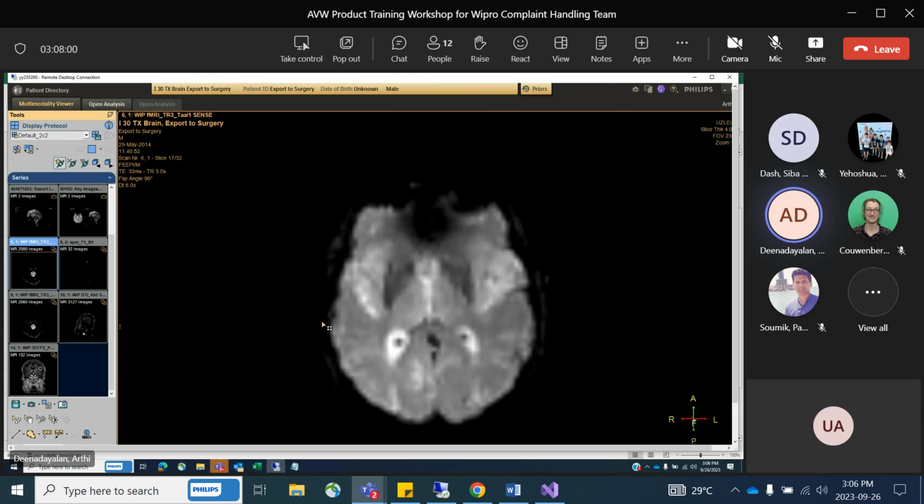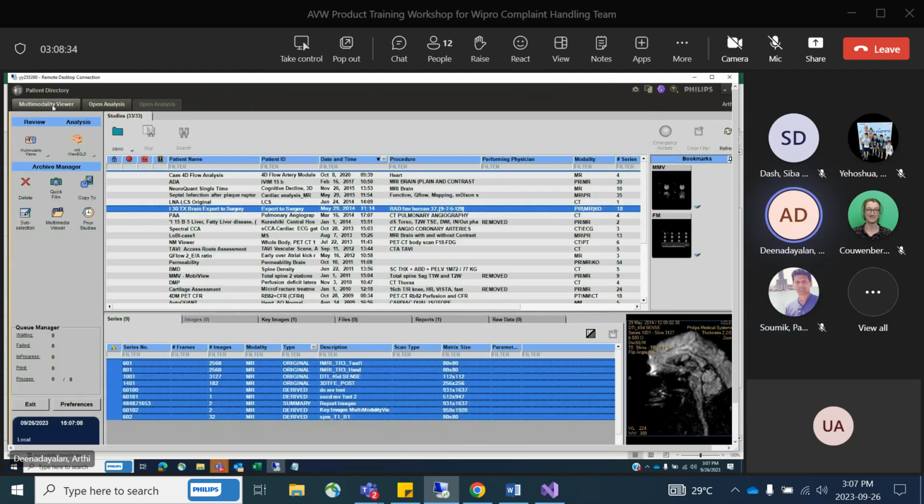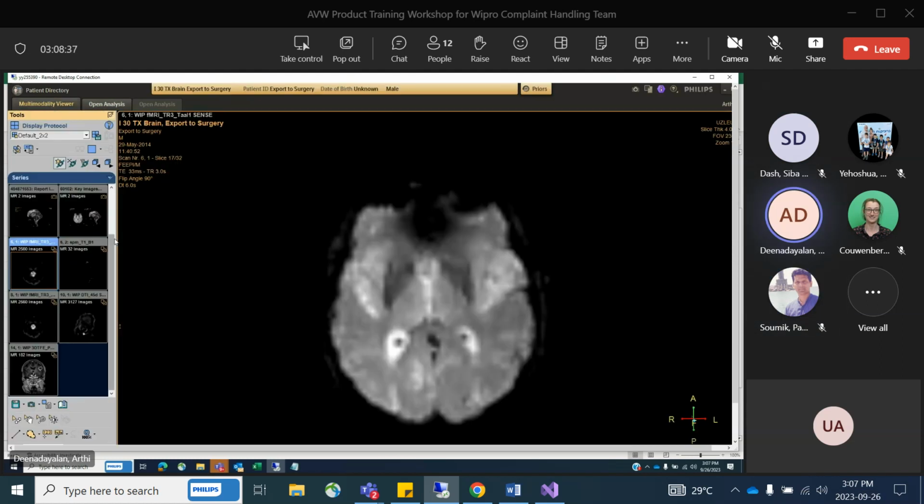So far, any doubts? How to check the dynamics, how to load the data to fMRI. The basic functionality on fMRI is only that. There are many other things, but I don't think you have to know all those things; these are the basic things. Can I go ahead with the next application? Yes. Okay, so I would use the same data as well.